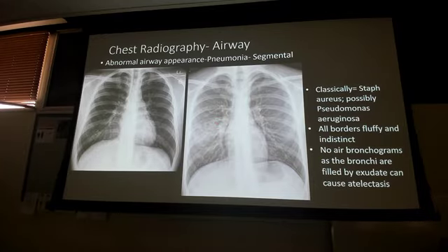Yes, sir. Just a follow-up on that one. Does it have anything to do with the outline of the heart showing more, not like a pneumopericardium, but like that? As far as this x-ray goes, for the segmental, not necessarily. That's not going to be the key thing to look at. Yeah, good question.